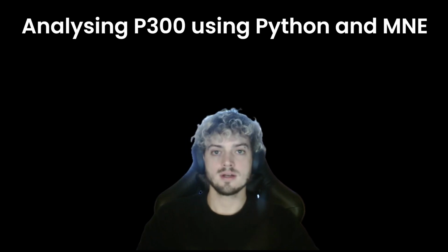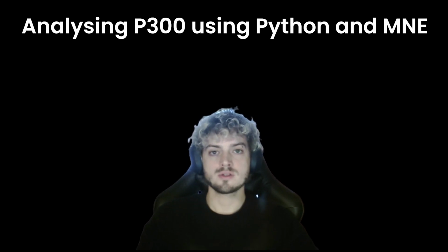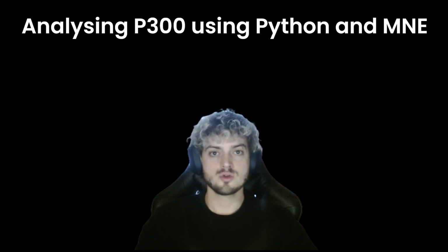On analyzing EEG data. So in this video, we will see how to analyze data containing the P300, a very well-known event-related potential in the field of neuroscience and, of course, brain-computer interfaces. So this task has been done countless times, and it's usually the perfect task for beginners to understand how this mechanism works in the brain, but also for building a BCI.